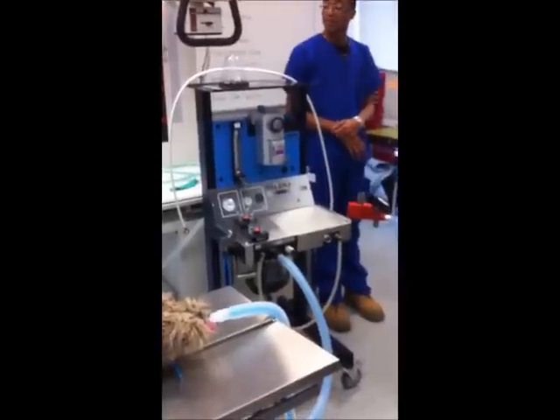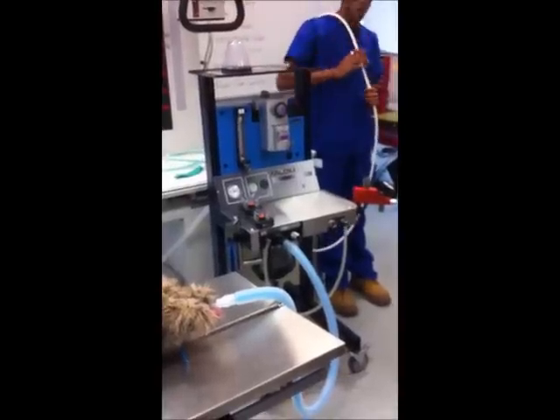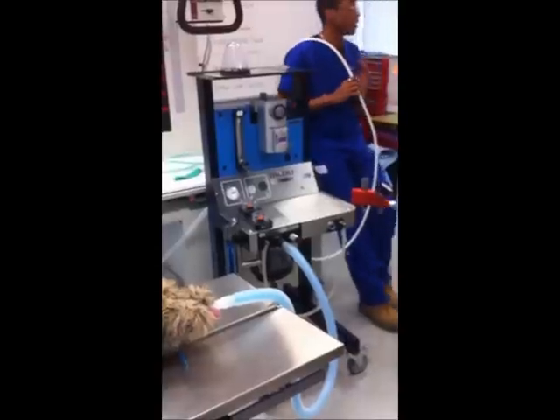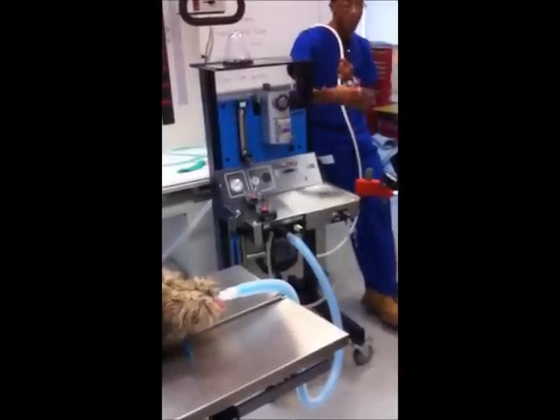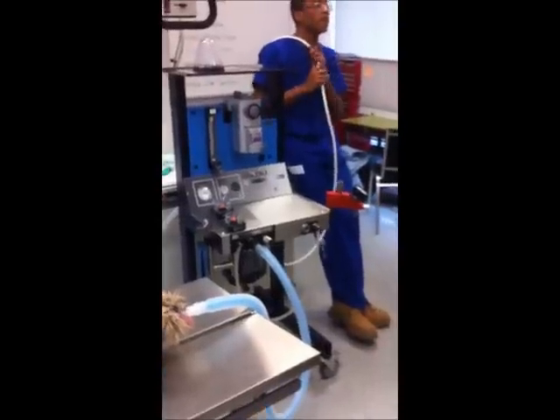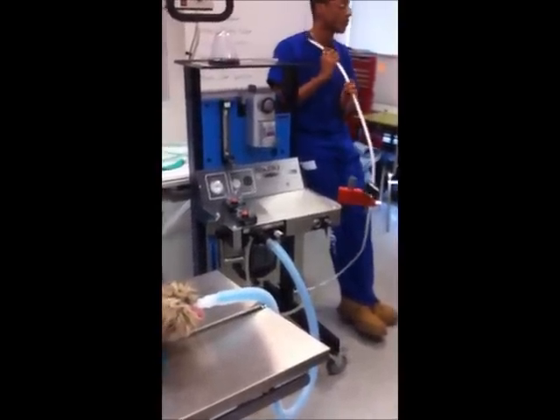You've been taught how to set up, so you don't need to worry about that. The main thing you do need to know is how the circuitry and the hoses and everything are set up, and you do set up the right one according to your case study. You also need to know that your oxygen flow meter is in liters per minute, and your vaporizer is in percent.